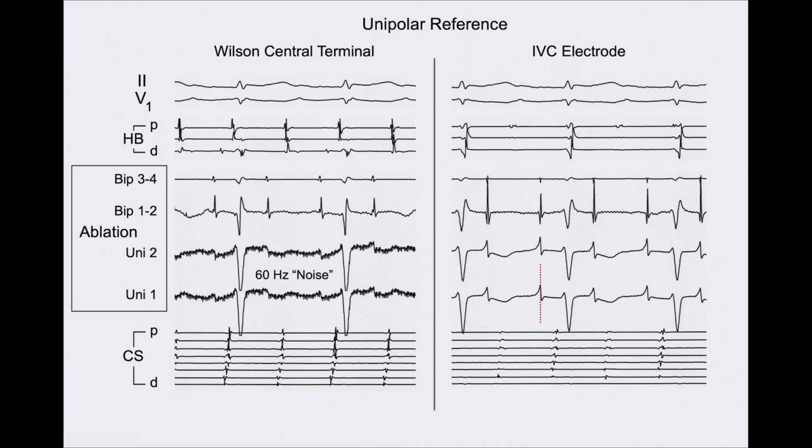It's very easy to time the atrial signal here, whereas imagine timing the atrial potential here. I guess you would take it somewhere along here or somewhere along here, but really you don't really know what's in here. And it's really very helpful to be able to get away from the Wilson Central Terminal, and that allows you to turn off the notch filters.